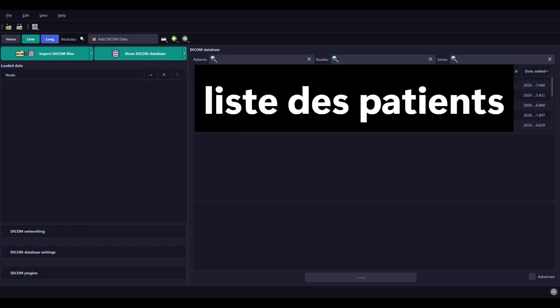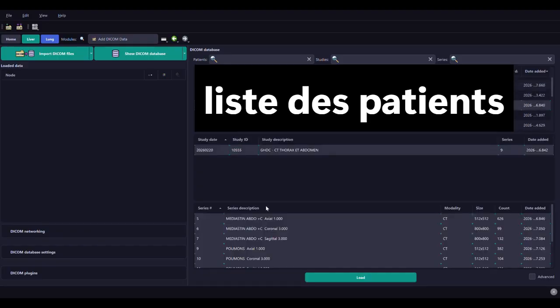Once you've chosen your patient, you can select the type of series you want. Generally, you should always choose the series with the most slices. This will improve the quality of the 3D segmentation. So I'm choosing an axial series, contrast enhanced abdominal with 626 slices.